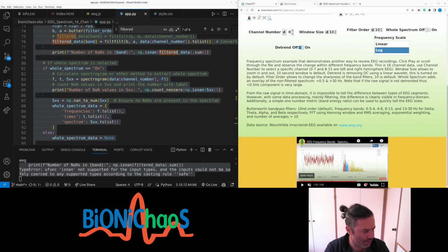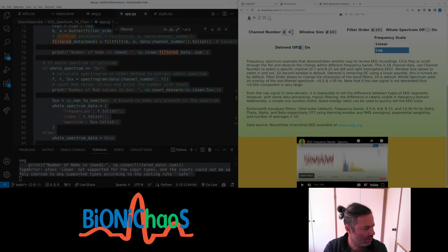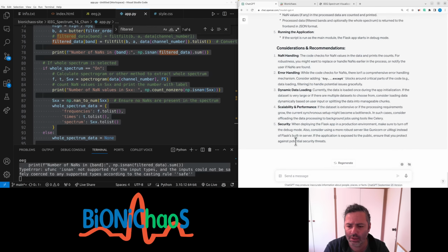This goes, just grab that print screen. Right. So it should look like this.